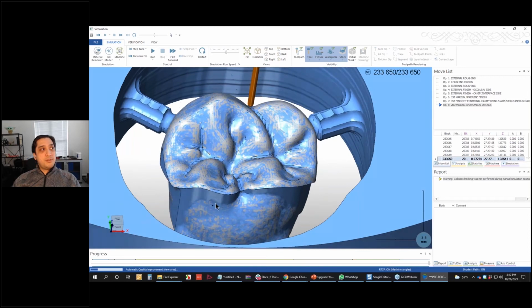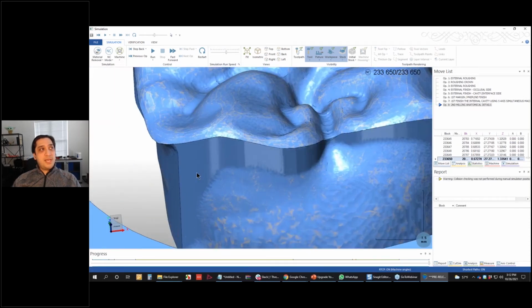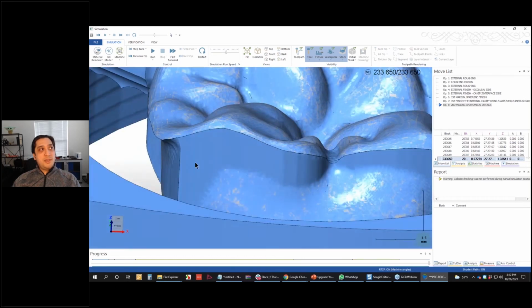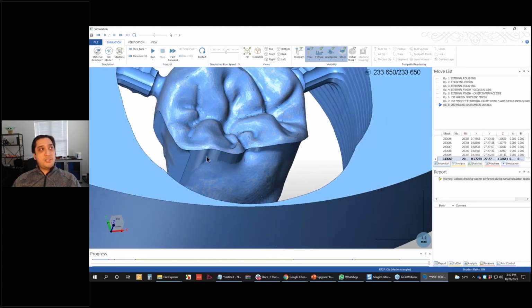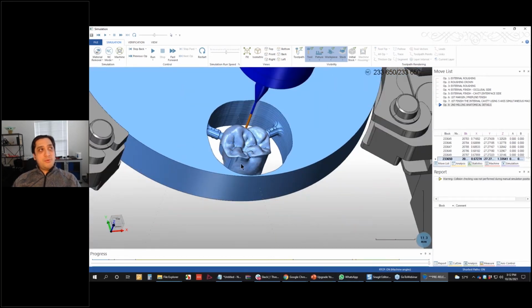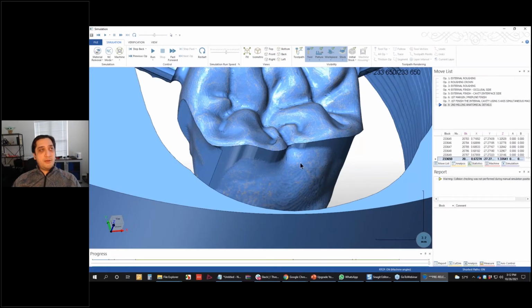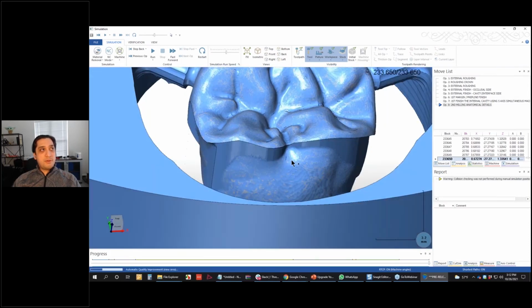Now I chose not to mill out any of the 5-axis external undercuts. So this is actually how it would come off the machine, because I made that conscious choice to not mill these undercuts. So we'll show you what that option is that you need to select to be able to mill this, just to clarify that for anybody if they're confused by that.